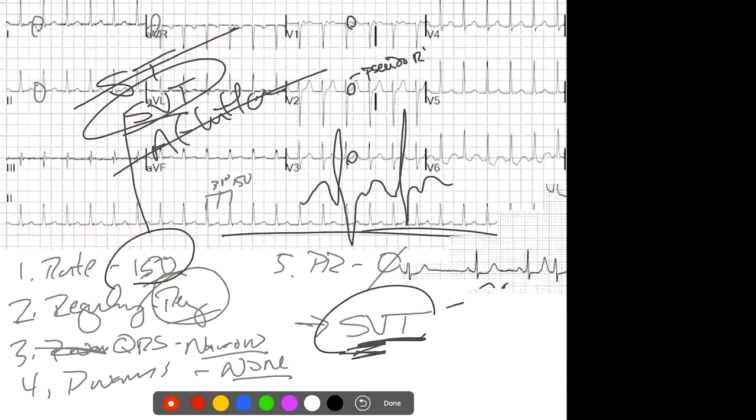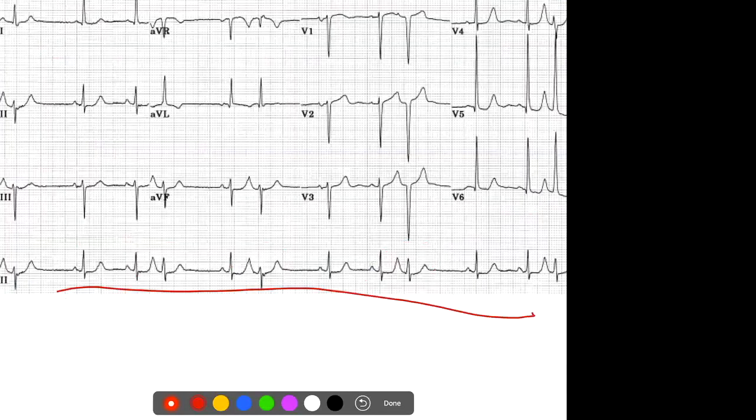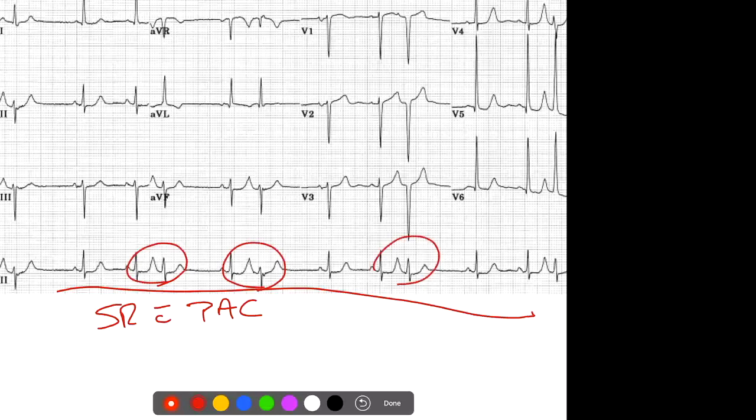So the full interpretation of this would be a sinus rhythm with PACs. Okay. And so these are your PACs right here.